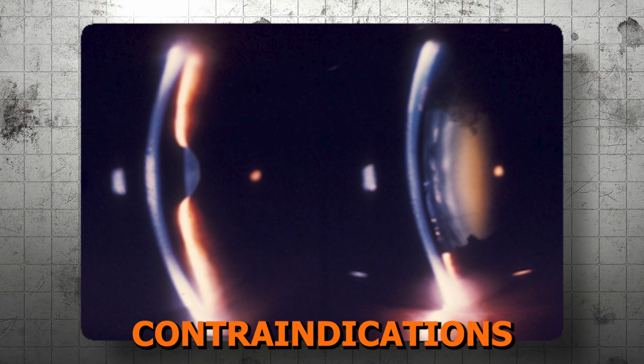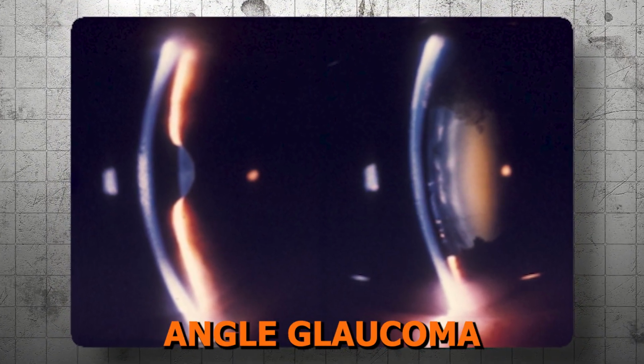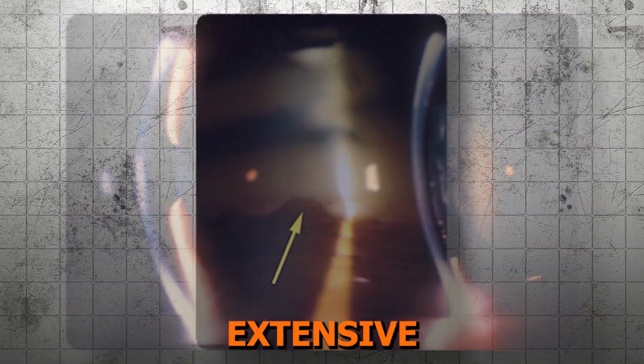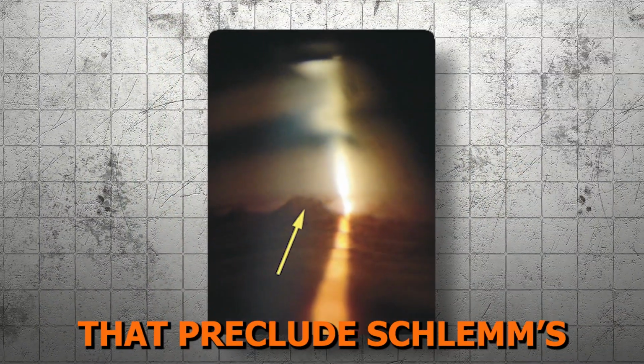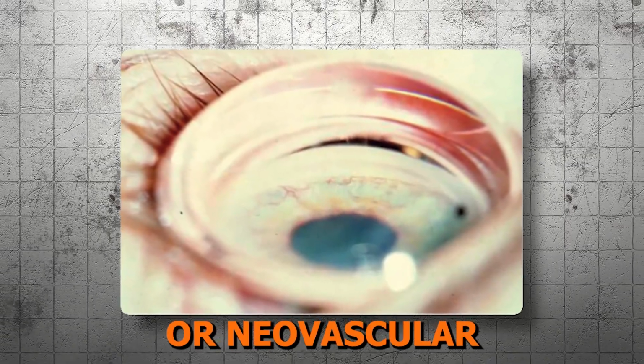Now, what are the contraindications for canaloplasty? It is contraindicated in patients with narrow angle glaucoma or chronic angle closure, extensive surgical histories that preclude Schlemm's canal access, significant angle recession from trauma, or neovascular glaucoma.